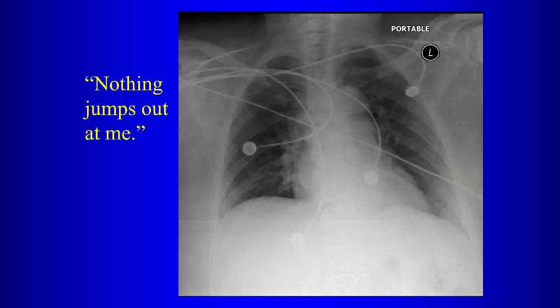Anything there? What side? Yeah. So on the right side, right there. Okay. And you'll say, well, isn't this obvious clinically? Well, what happens is with a lot of the patients, they may be obtunded, they may have altered mental status.